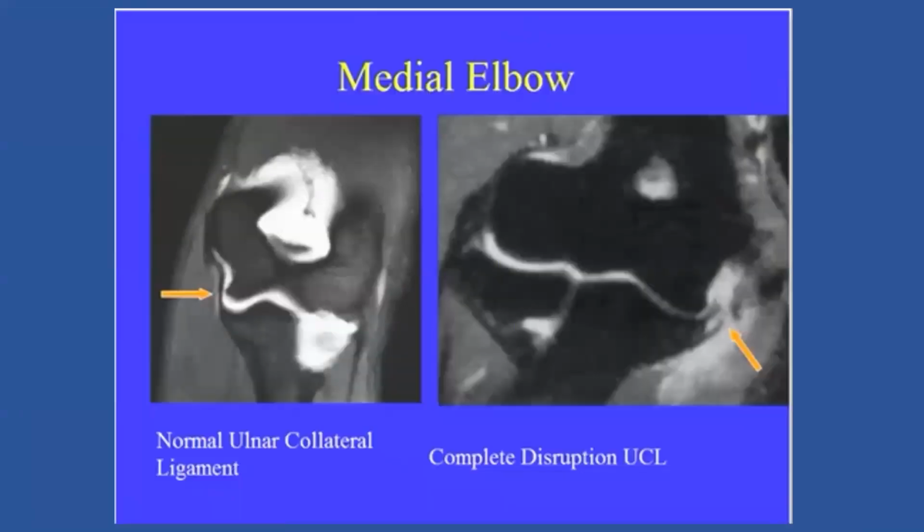Okay? So also you have to think of the medial collateral ligament, which can be ruptured over here on valgus injuries. This is what I was trying to explain at the beginning. And this shows you how the ligament is ruptured from the sublime tubercle.